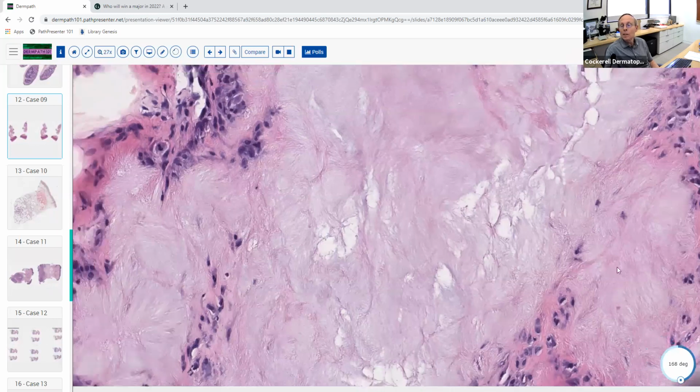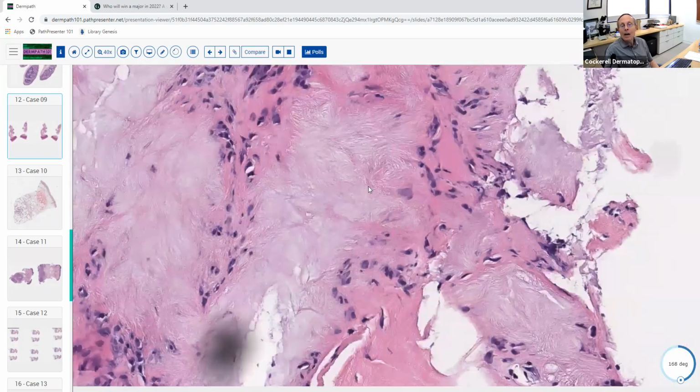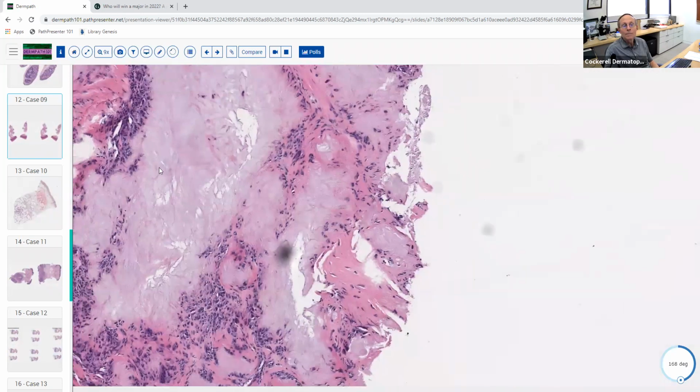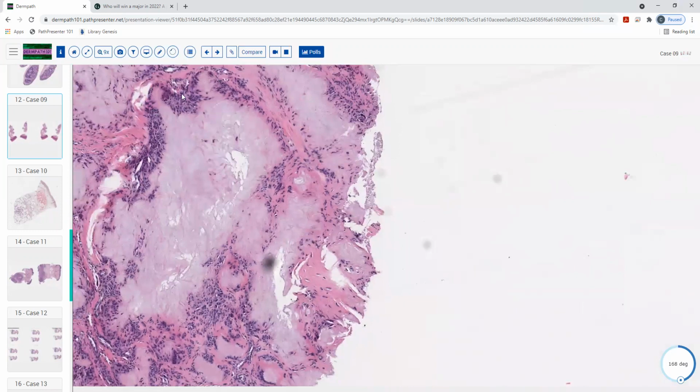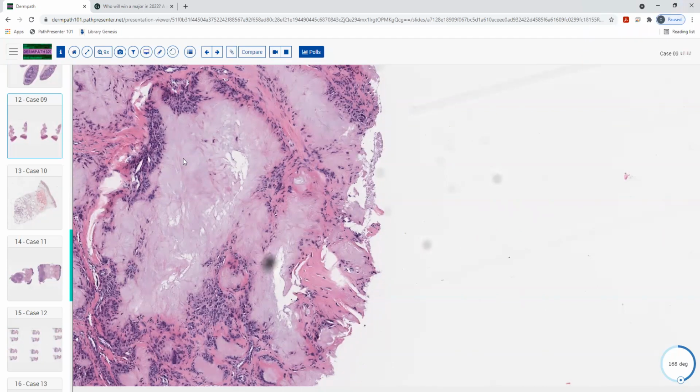So this is one of the ones that you want to look at, recognize, and say, this is gout. And basically, what's the inflammation doing here? It's kind of like a foreign body reaction almost to crystals. That's exactly right. This is a foreign body. Normally we don't put gout crystals in our skin. And when they come in there, your body says, wait a minute, this is somebody who may have well injected this in you. So yeah, it's actually a foreign body reaction.